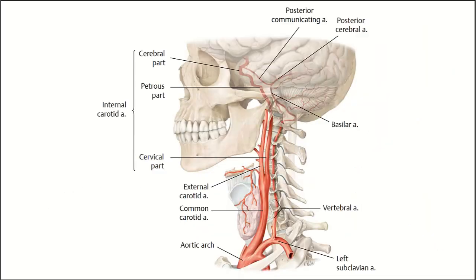Let's start with orientation. Once people look at the arteries, they get a little confused at the direction. So in MRA, you're going to see all of these vessels. It's going to be from the head up. We're going to see the two vertebrals back here becoming the basilar. We're also going to see this internal carotid artery doing a wiggly way up, and it's going to perfuse primarily the middle and anterior cerebral arteries.